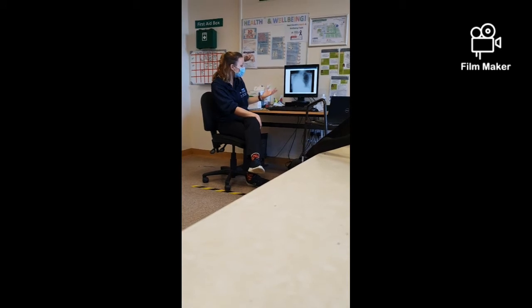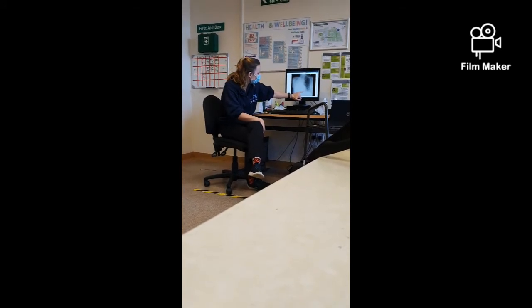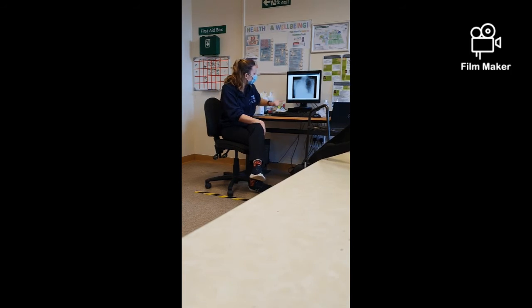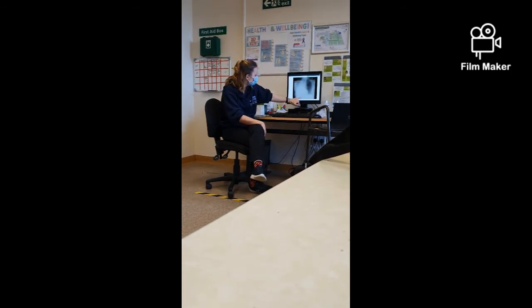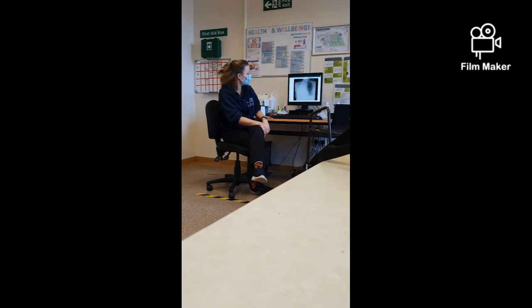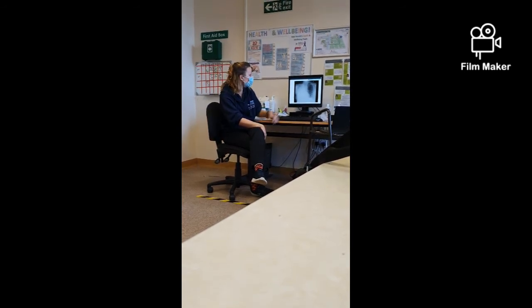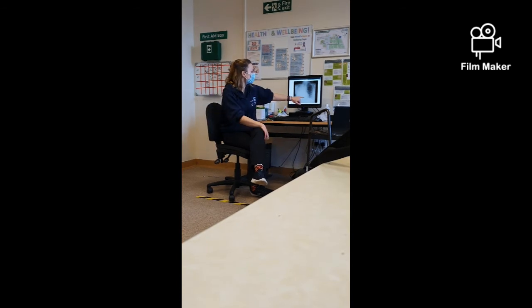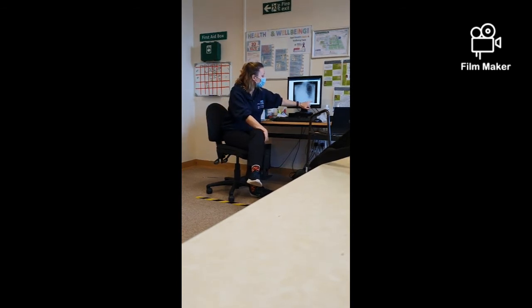Okay. Diaphragm. Take a look at the diaphragms. It's a lot higher on the right. Quite flattened on the left. Yeah, so that means potentially that's because he's taken a breath in, hasn't it? So as you take your breath in, your diaphragm moves down, so potentially that might be quite flat. But I mean, what can we see here?